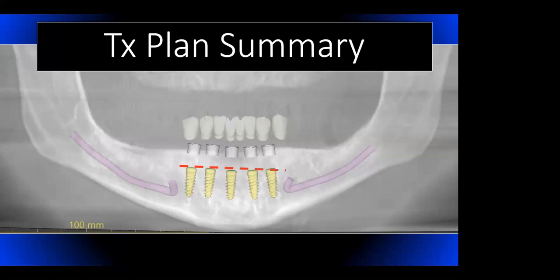So you're going to have to do an osteoplasty. But if it's an overdenture, make sure it's an extensive osteoplasty, because the more room you have, the easier the prosthetics. Now, another little trick here, or a possible complication, is that a lot of doctors will do an osteoplasty like this. They'll just do the osteoplasty from foramen to foramen.